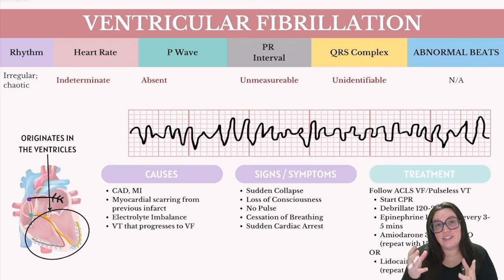What's key to note here is that ventricular fibrillation is one of the few cardiac emergencies where immediate intervention with an automated external defibrillator, also known as an AED, can revert the rhythm back to normal, potentially saving this person's life. So let's talk about rhythm identification.